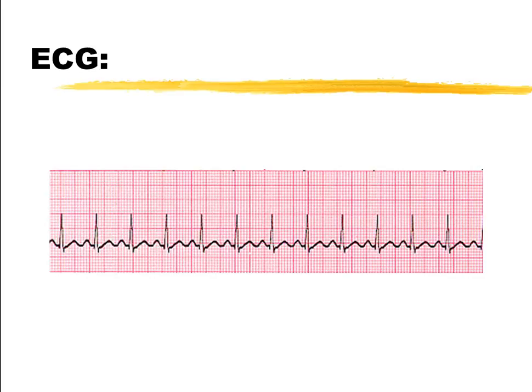So this is what one looks like. I chose one that you could easily identify the P and the T's as separate. So here you go. It fits that category. Again, if this was a 6-second strip, what would be the rate? 1, 2, 3, 4, 5, 6, 7, 8, 9, 10, 11, 12, 120. Above that minimum range, we're above the regular rate, which is 100, so we're 120, it's well over that. Looks the same, looks normal, but it's just fast.